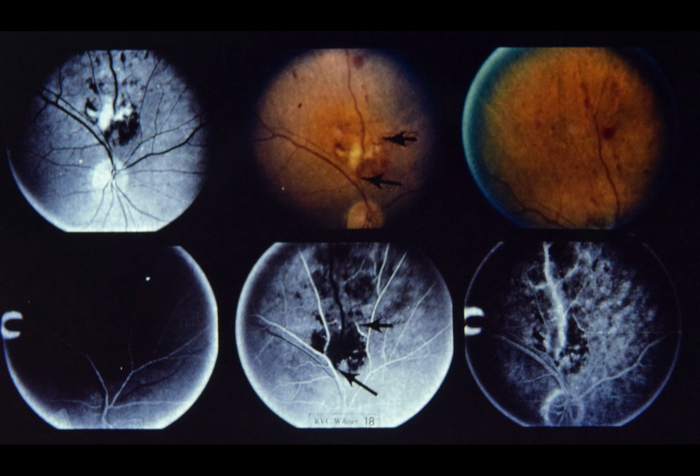Comment: this patient demonstrates coexistent arterial and venous occlusions. Richard Clement, working at Moorfields Eye Hospital in London, performed serial fluorescein angiograms on patients with branch retinal vein occlusion and demonstrated progressive obliteration of arterioles passing through areas of retinal non-perfusion.